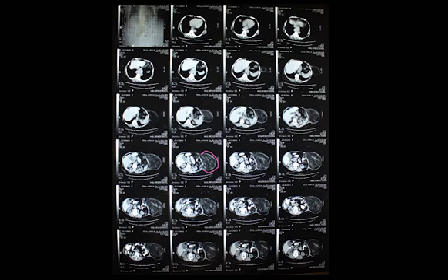It's occupying the vast majority of the side and the flank of the left side. What about its density? Heterogeneous, hypodense. Is it intra-abdominal? No, extra-abdominal. It's parietal again. What density is it? Hypodense. Is it one single thing or is it lobulated? It's a single heterogeneous lesion.